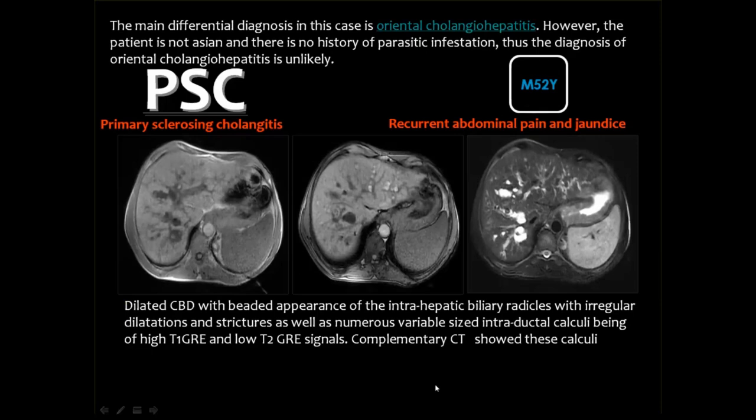And also this is another appearance where you can see the biliary radicals are dilated, and inside the bile ducts you can see multiple calculi.